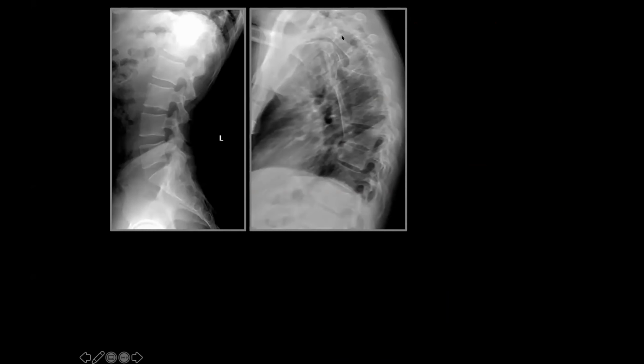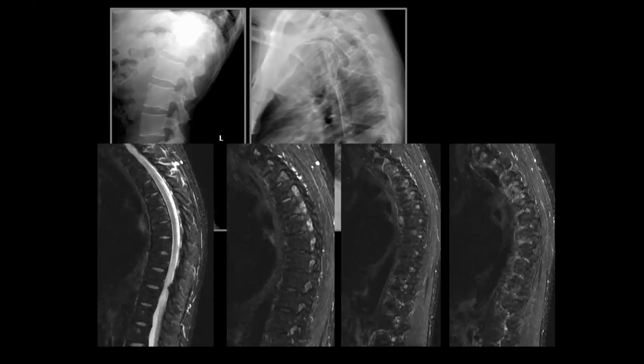So now to go back to the same patient that I showed earlier, a 38-year-old male with a long-standing history of AS. This patient has severe pain, normal x-rays, besides that he had sacroiliac joint ankylosis. This MRI was read first as normal, and the patient had severe pain.